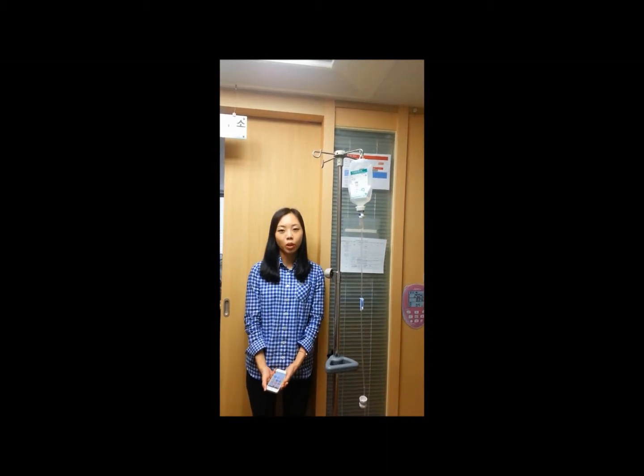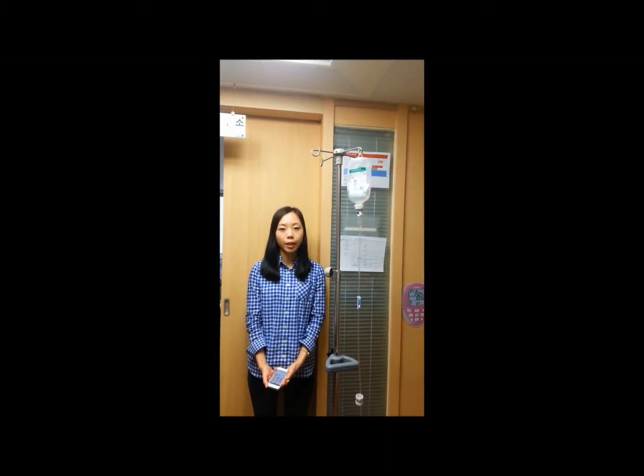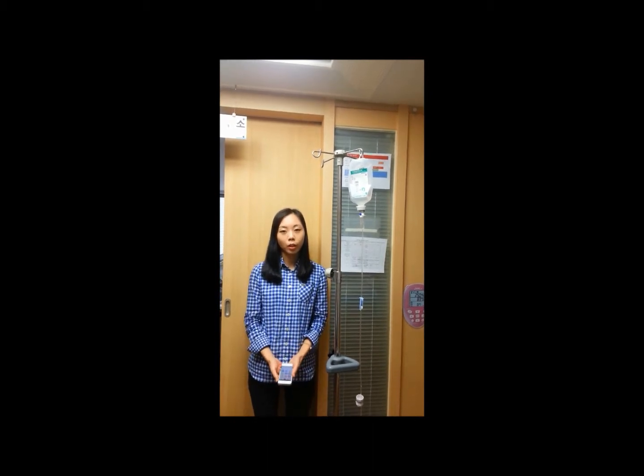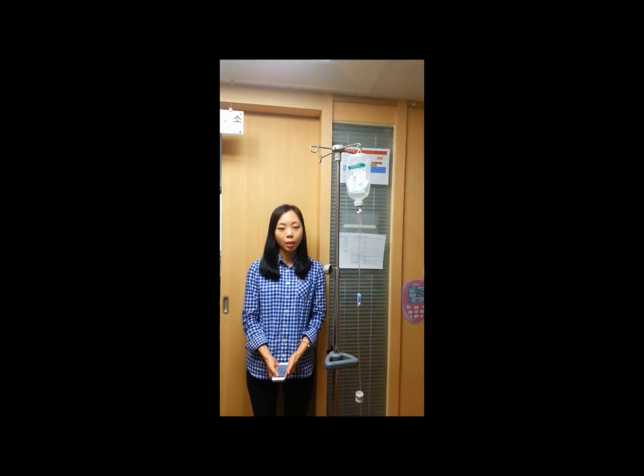My name is Jiwon. I'm in charge of overseas marketing for Hanbit MD. I'm here today to talk about an application we have developed called the IV Therapy Helper.